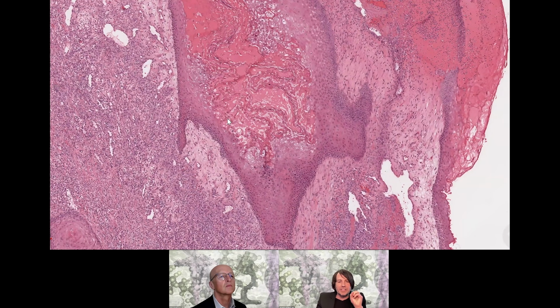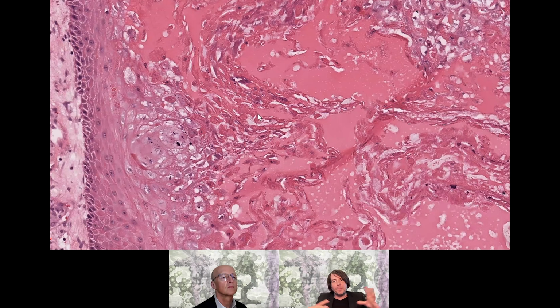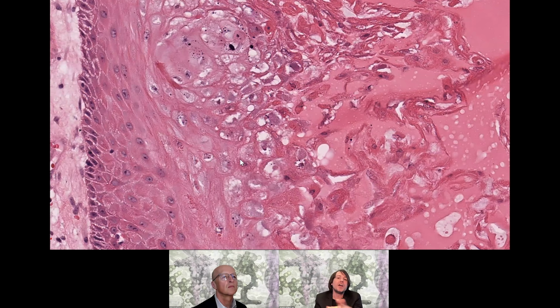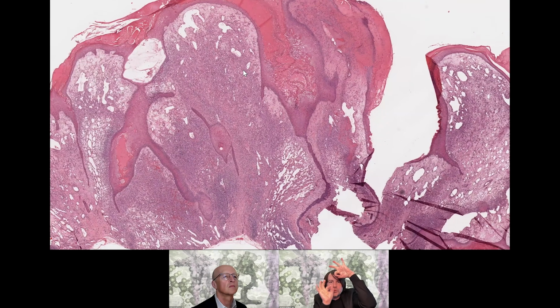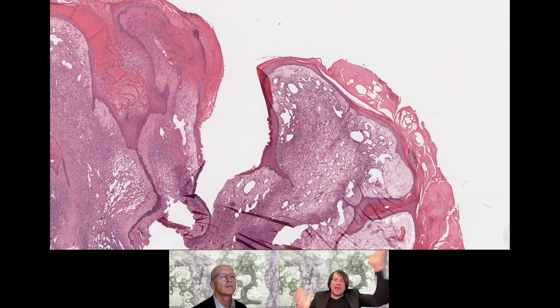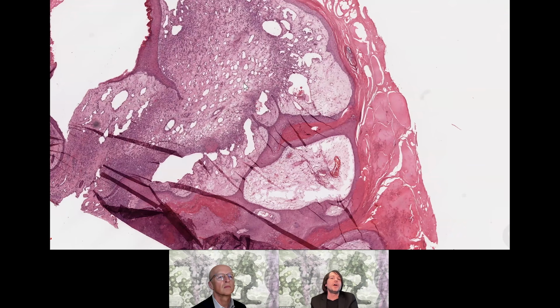There's a virus that has different stages, right? So as it progresses, it gets more and more edematous. Then you get this massive expansion of the papillary dermis. The rete get really elongated and very, very thin. So that is the one thing here. It looks like pseudoepitheliomatous hyperplasia, but you can see some areas the rete are extremely narrow, which is a little weird because usually when we see reactive pseudoepitheliomatous hyperplasia, it's kind of expanded, dilated, and there's some of that here, but there are also these really thin, delicate, stretched-down rete.